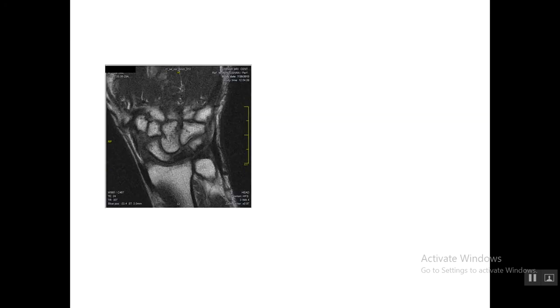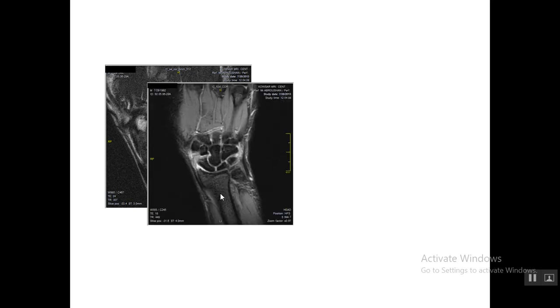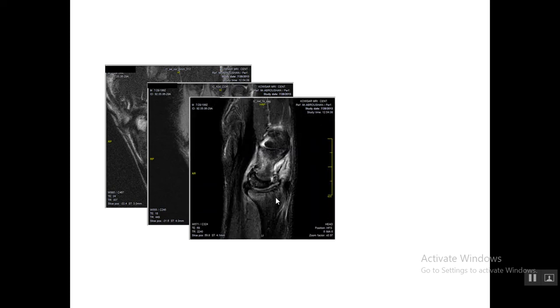The next case I would show here is a case of wrist pain, and as you know, a coronal T1 MRI image of the patient is available. Here you can see normal bone marrow density of bony structures, especially the carpal and distal radioulnar bony structures, but an abnormal finding is low signal intensity of the smallest of the 8 carpal bones, which is the lunate bone.